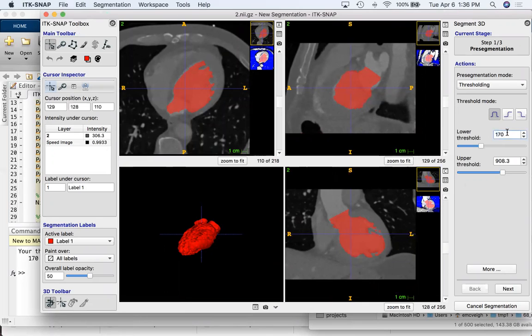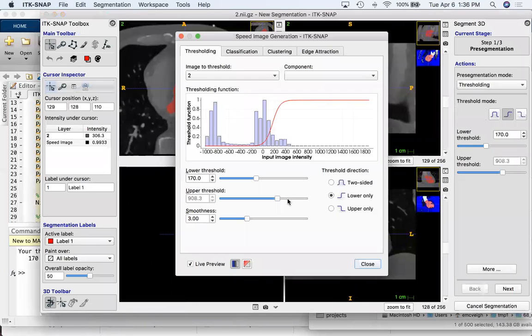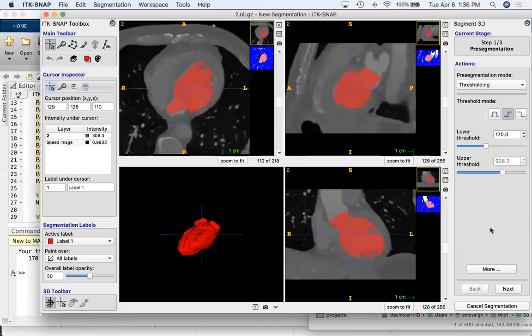Okay, so maybe I have to cancel because I didn't select the cancel. Okay, I go here, I select that. I go here, initialize. Okay, I see. You become a robot, as you can see. I know. You do this 20 times, right? So it's hard to maintain your concentration and do it all right.